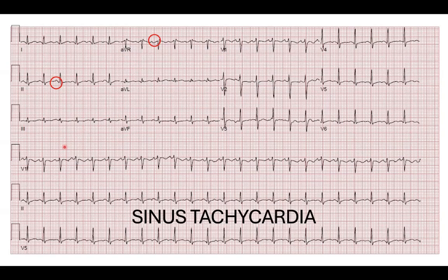This is actually just a sinus tachycardia, and I wanted to include it here because technically sinus tachycardia is a narrow complex tachycardia, so always be sure to think about this as well when you're quickly reviewing an EKG for the patient you're getting called to about their tachycardia.